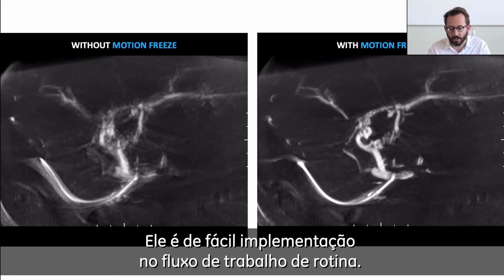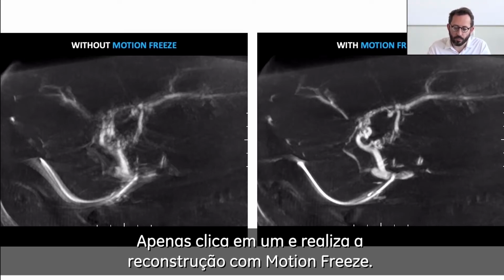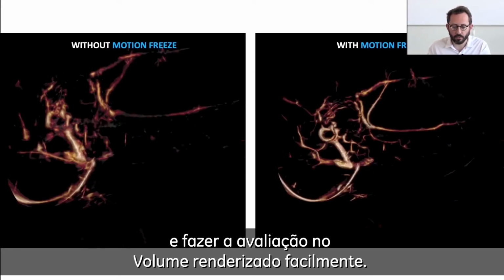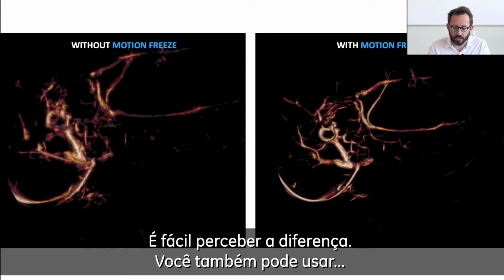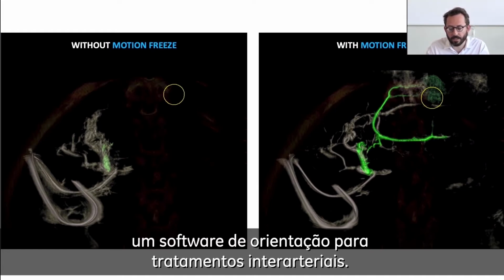You don't have to click on several buttons. You just click one thing and then you get a Motion Freeze reconstruction. So you can view and work on these images. You can process those images. You can do the volume rendering easily. It's easy to see the difference. And you can also use guidance software for the intraarterial treatments.